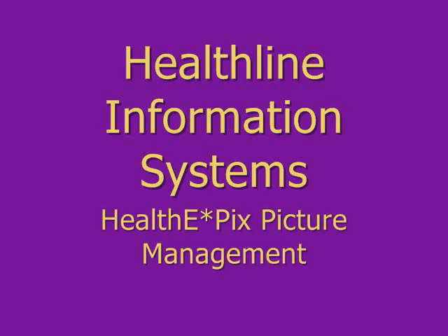HealthEPix is a workflow-based application that allows you to import, classify, annotate, and archive image data from practically any source. When you use HealthEPix, you can eliminate the shoebox method of picture filing in favor of a centralized, secure index data store that can be integrated with your hospital or practice management system.